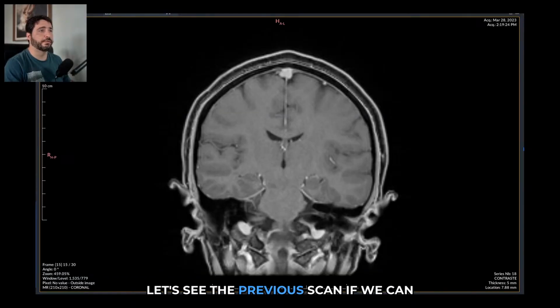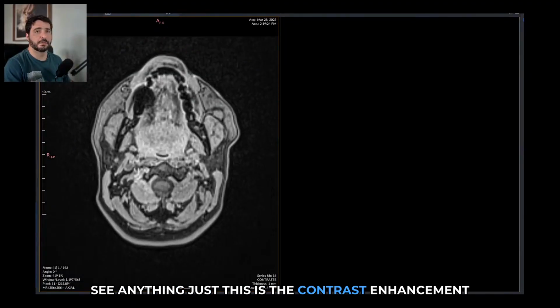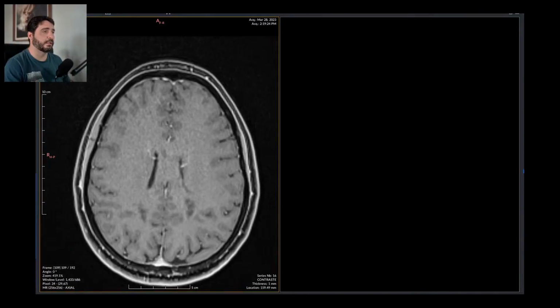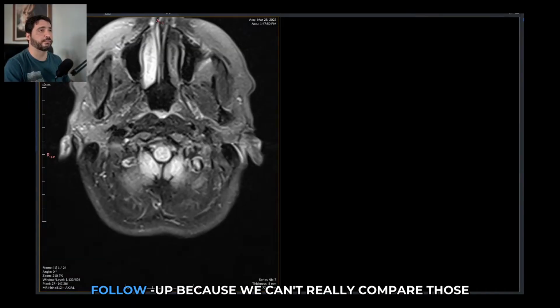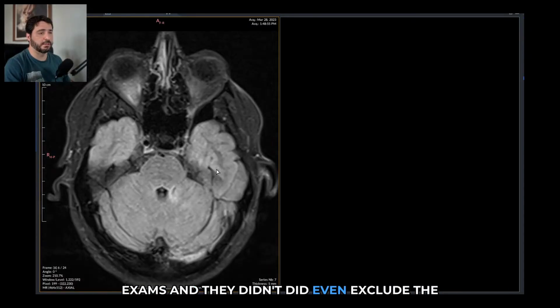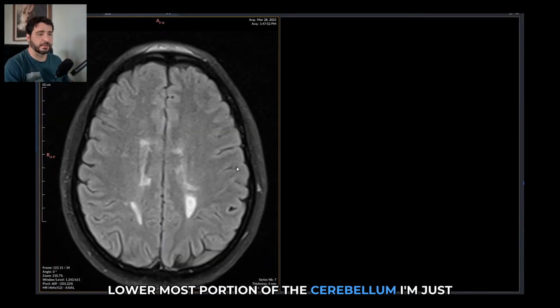Let's see the previous scan if we can see anything. Just this is the contrast enhancement from the previous scan. No, it's all right. Let's see if we have a volumetric FLAIR on the previous. Once again, they didn't do a volumetric FLAIR previous to this scan, so we won't be able to do a proper follow-up because we can't really compare those exams, and they did even exclude the lowermost portion of the cerebellum.